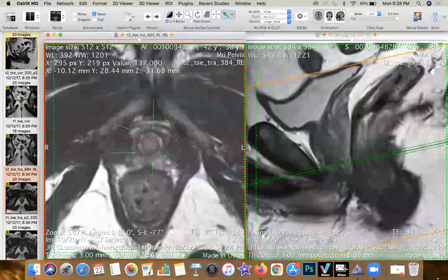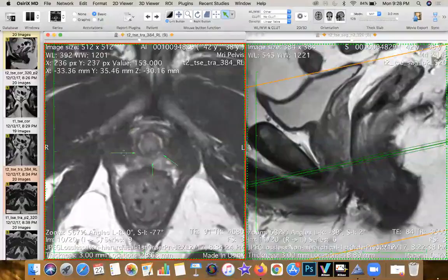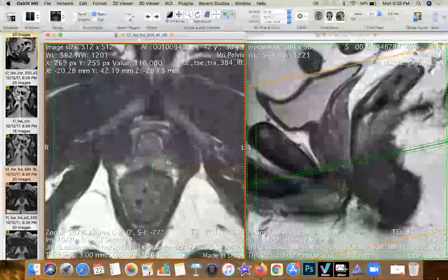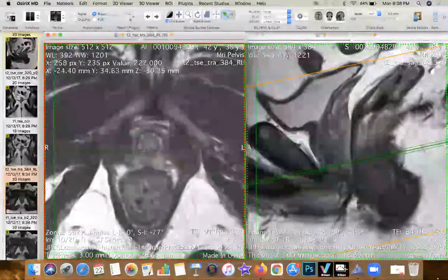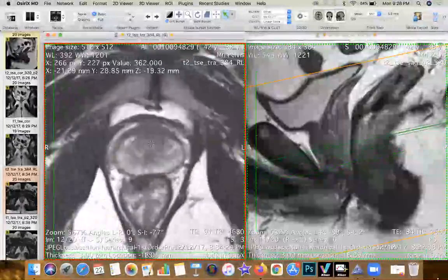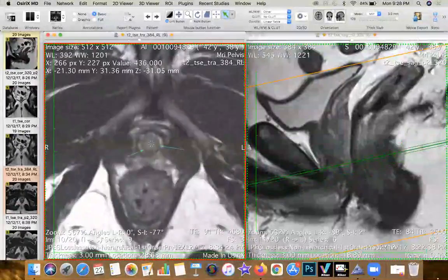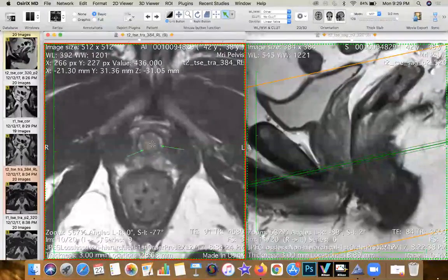This is a composite of two structures, that is the internal sphincter complex or the smooth muscle complex and the submucosa. Below that, the darkish gray lining is the mucosal lining, which you can see here. And then you have the core of the urethral cavity or the lumen, which is brightish in signal itself. So that is the classic four-layered pattern which you're envisaging of the urethra.